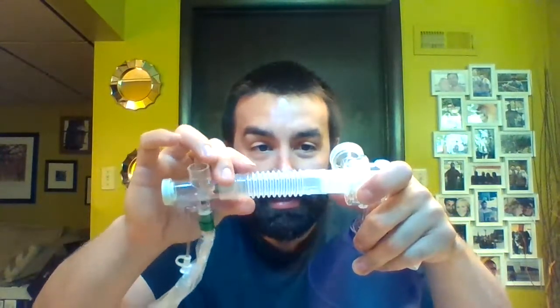Essentially, we're pulling stuff in. As we squeeze that and it's inflating, it's going to pull stuff from the reservoir again. Over on this side is where people really struggle, and every Ambu bag's a little bit different, and everybody's been through this before where you're struggling. But all of them are going to have a spot that is essentially going to take that 15 millimeter outer diameter of any of our artificial airway equipment. Let me grab my ET tube here again. You can see this is going to hook right on like that. Likewise, in regards to airway troubleshooting, remember all of our equipment uses universal measurements. Corrugated tubing, we've got the 22 millimeter inner diameter, 22 millimeter outer.